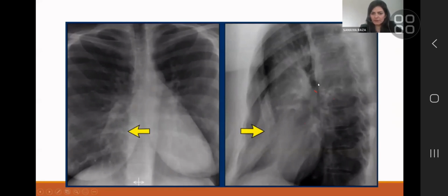And the other thing to consider on the lateral view, while we have it on, is that the lung gets more lucent as it goes down. So that's the most important thing to remember about the lung appearance on a lateral view. You shouldn't call these vertebrae abnormal. You shouldn't call this consolidation on the top. A normal lung is thicker or bigger as we go lower down. There is more air in it. There is more space for the X-ray to go through. So a normal lung always gets darker as you go down in a lateral view.